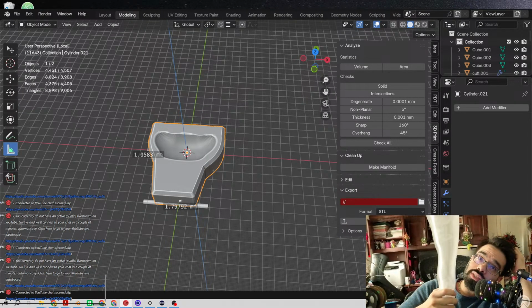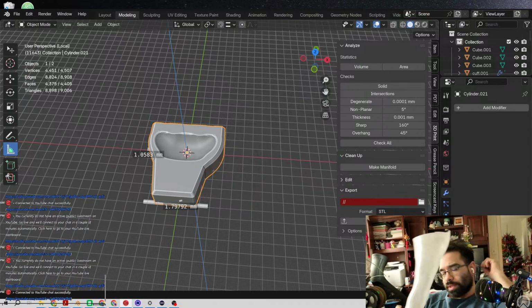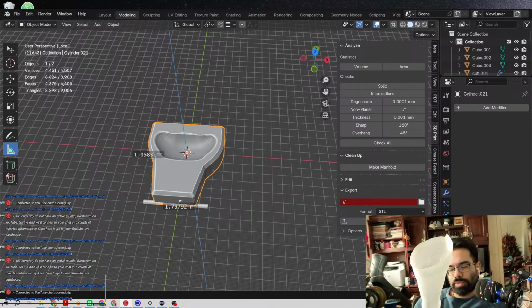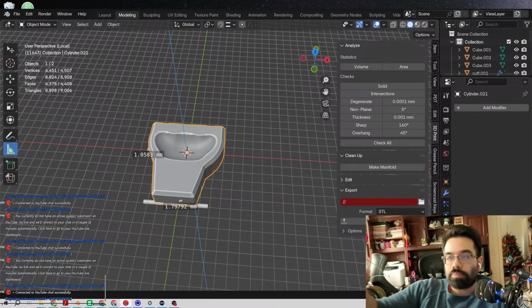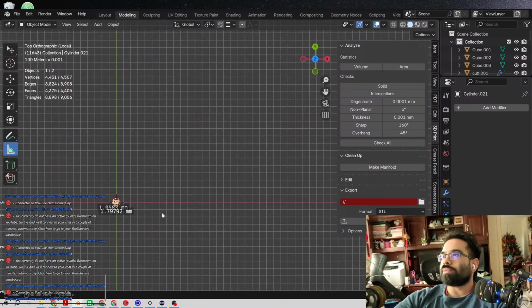So, we made a test socket yesterday with the silicon inner. I sent this out to the client, the clinic, earlier today. But this was the one that had failed, had fallen over and broken. But today we're gonna help my police officer friend here make something for his cuffs.